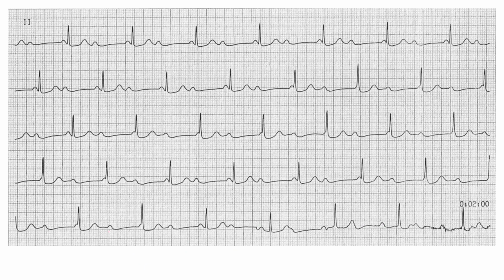Here again you can see this is the P wave here. Here there is a P wave buried inside it. Here there is a P wave. Here there is a P wave. Here there is a P wave. So P waves are happening at their own pace. That is around 1, 2, 3, 3.5, so around 80. Atrial rate is around 80.